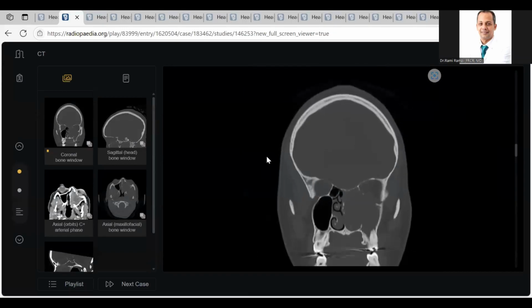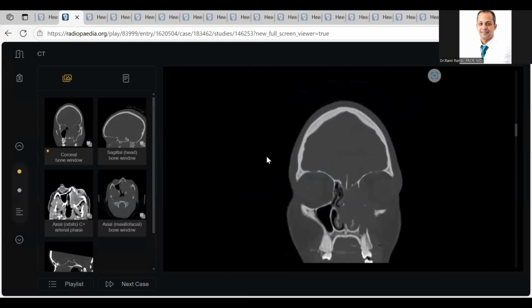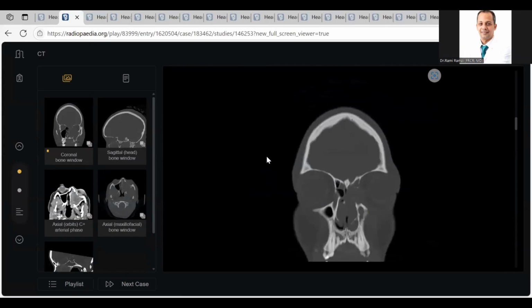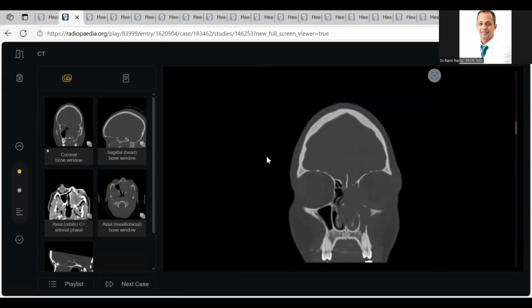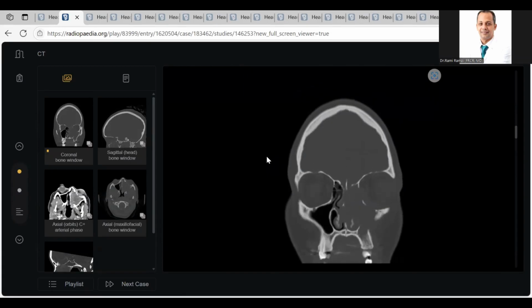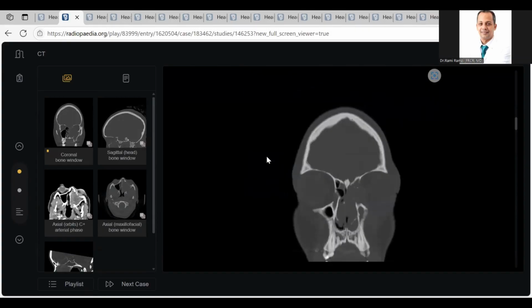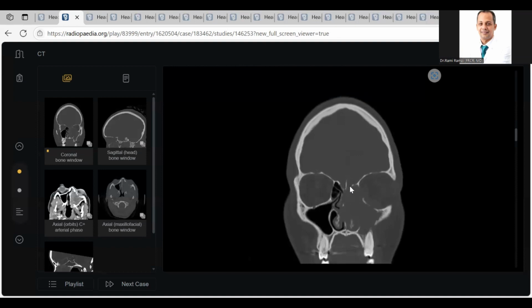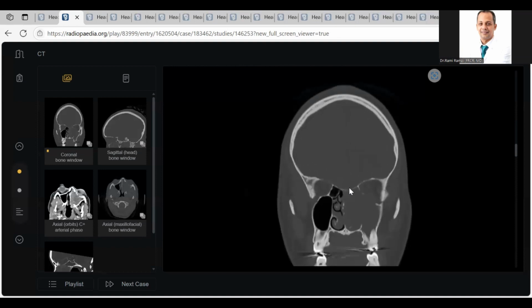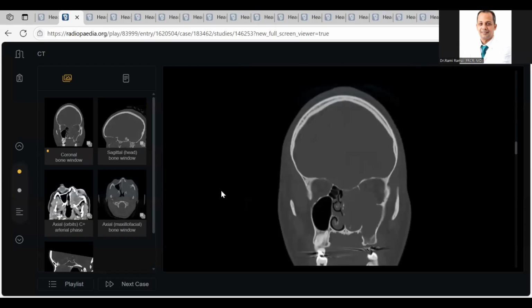Take some notes for you. See, here you find from the first 10 seconds, this is an aggressive destructive lesion. And you describe the extension. Don't take more time in more description. The examiner understands that you detect the aggressive nature. Then you give the next step: doctor, I see there is an orbital extension and there is destruction of the cribriform plate. Please, doctor, could you show me the post contrast?